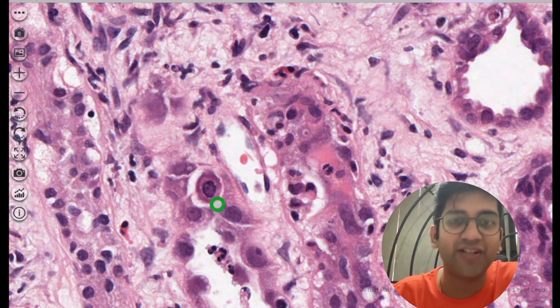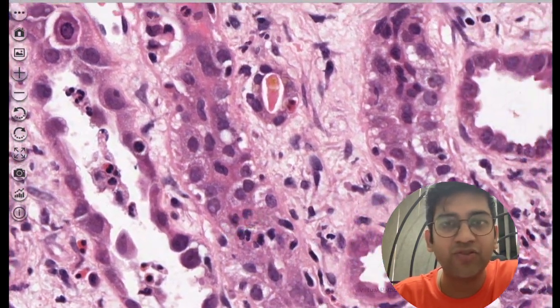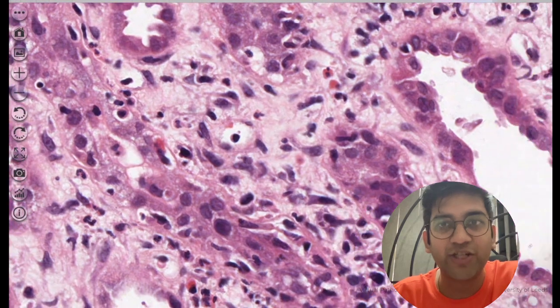That's a huge cell, right? Kind of granulation. This is more of clearing. This is a very classical inclusion body, which should give us a right suspicion of a polyomavirus, right? Let's go ahead. You will see them. Once you see one polyomavirus, you go and scan through it, you will definitely find more things that suggest the same nephropathy.